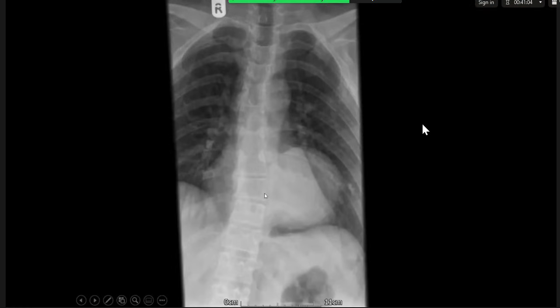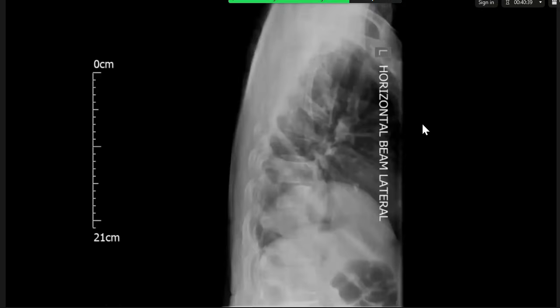It's a little bit difficult in terms of the penetration, but I wonder whether there's some lucency here, and then the inferior border of this, where there should be a rib, and I can't see that rib very clearly at all. I think the appearances are of a destructive lesion centered around the left paraspinal area in the lower thoracic spine. It also appears to have rib destruction associated with it.